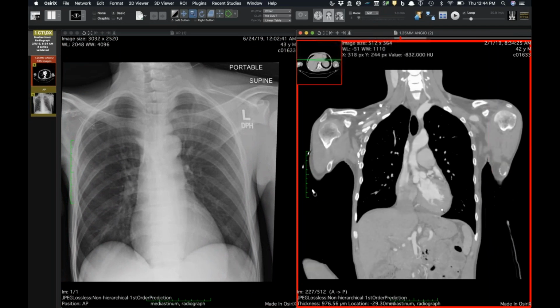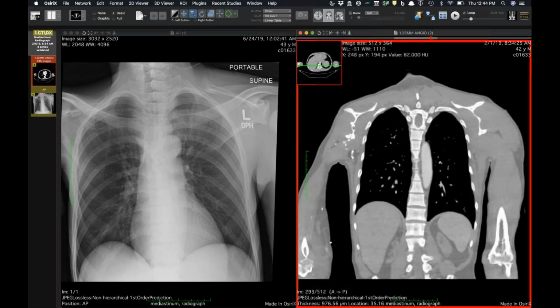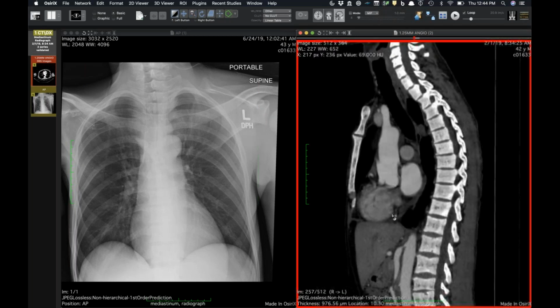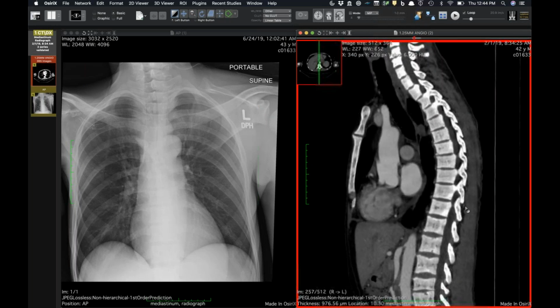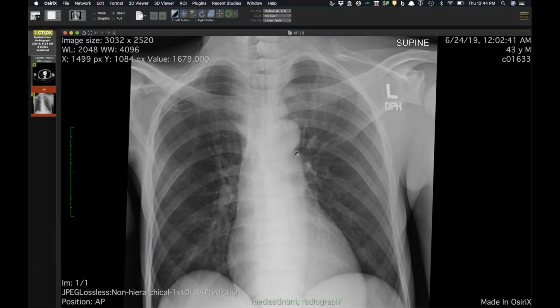Right. Yeah. And then I'll bet you that, can you do a sagittal of the T-spine? Let's look for any striped marshmallow-like vertebral bodies. You can almost see a little bit of rugger jersey even on coronal there. Let's see. Yeah, it's more just they're really dense. But yeah, certainly findings of renal osteodystrophy. Very cool. Yeah. So, I thought it's a cute little subclavian artery aneurysm. Yeah, that's cool.